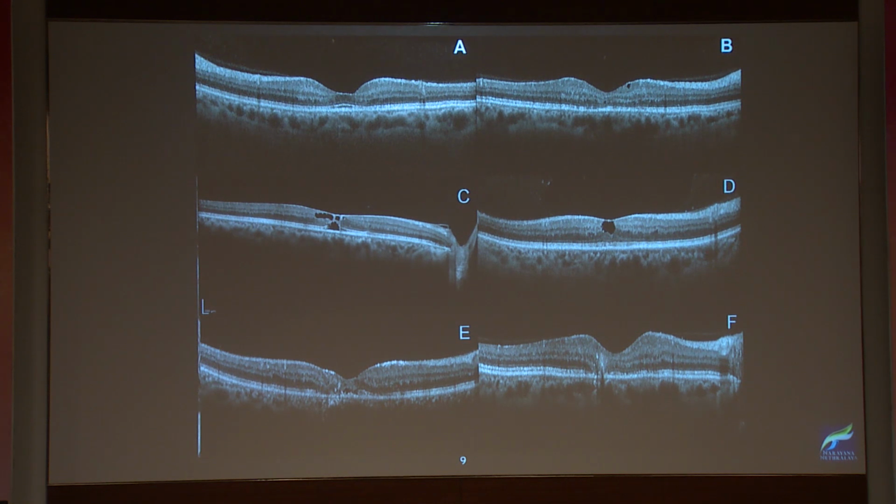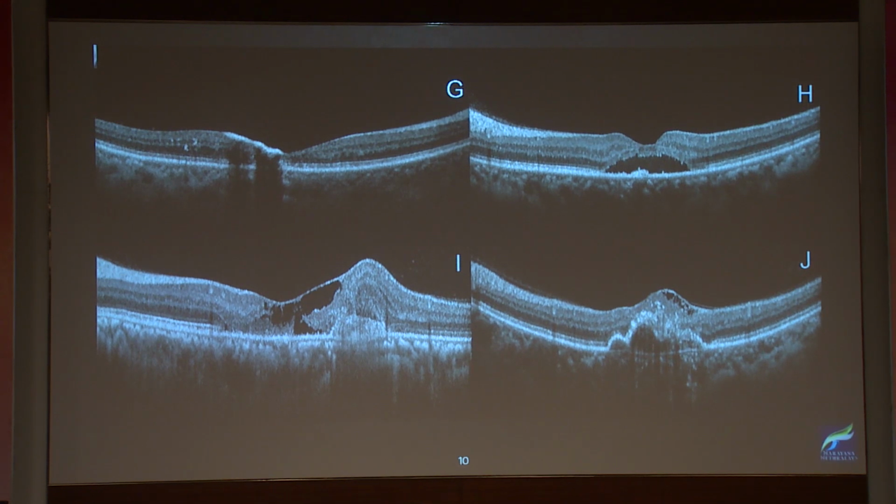Sometimes there can be intraretinal crystals which do not have classical backshadowing, and it can be associated with a subretinal fluid pocket. Here we can make out outward turning of the inner retinal layers. Sometimes retinal pigment epithelium clumps can migrate to the superficial retina with classical backshadowing.